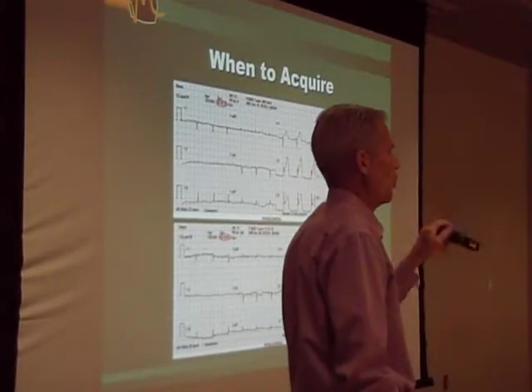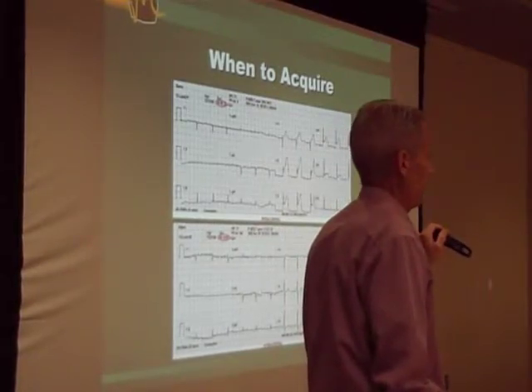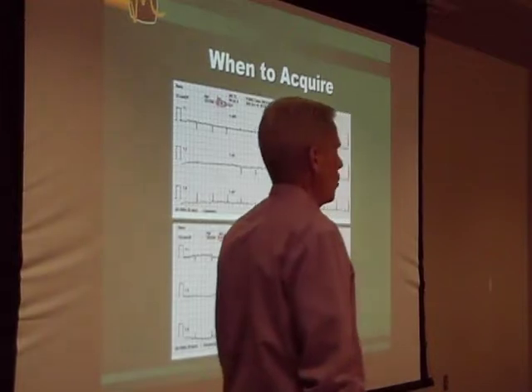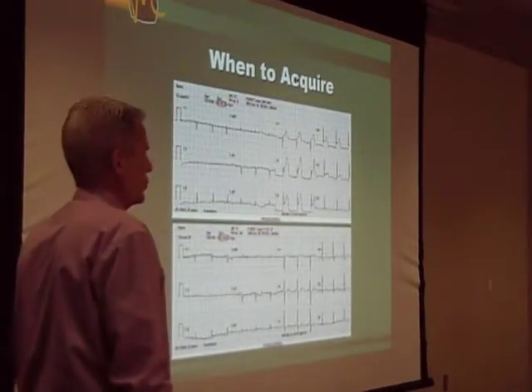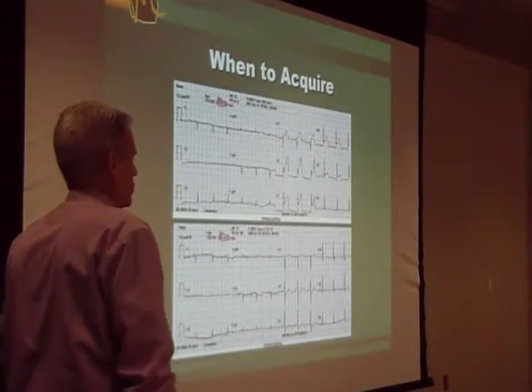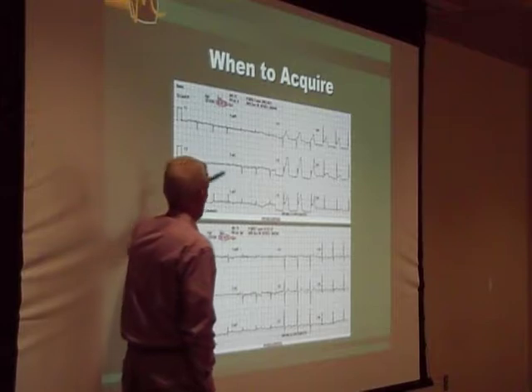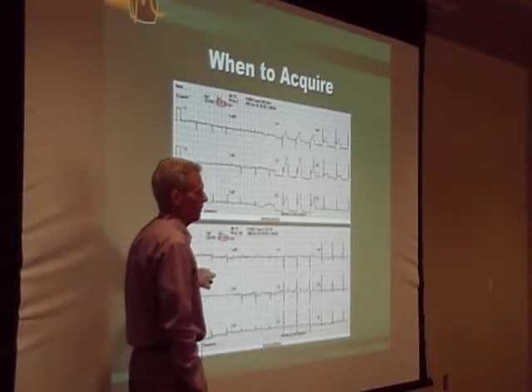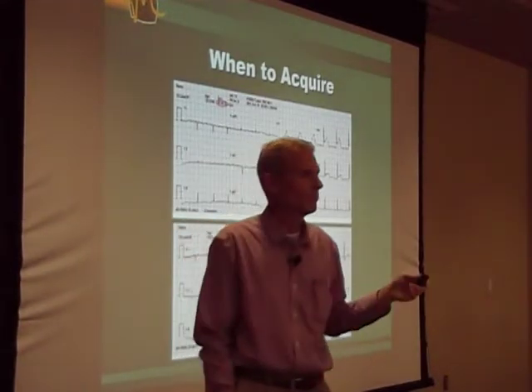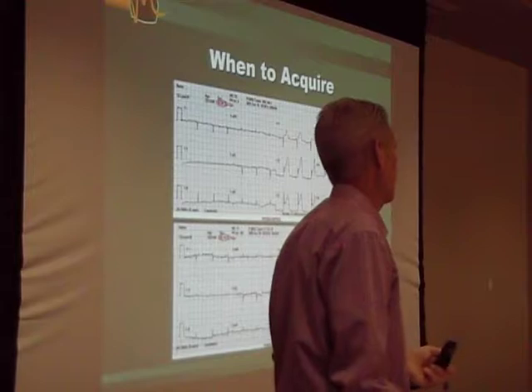Just as symptoms can wax and wane, so can EKG signs. Going back to my early statement today, one 12-lead does not a trend make. So you arrive on scene, you get to the patient, you acquire this, 10, 15 minutes later it looks like this. What happened? Is the infarct gone? Not necessarily.